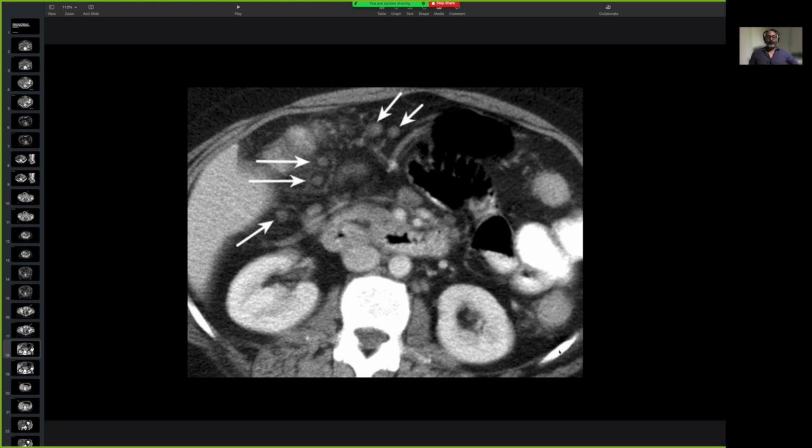Now, where are you? You've got the kidneys here. That's the stomach. That's the liver. So think, and they're mesenteric lymph nodes. So they're inside the mesentery. They're not extra mesenteric lymph nodes. So those are the gastrohepatic lymph nodes, because there's the stomach and there is the liver.